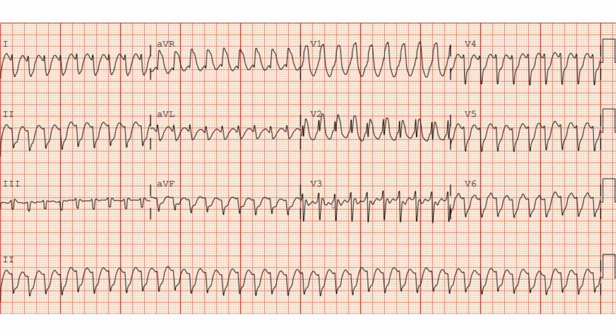Remember, all of these QRSs vertically are the same, so this QRS is the same as this QRS. So you pick a time where you know the QRS starts and ends. I mean, we can clearly see it starts here and ends there. When we follow this down, we can see, boom, that's the beginning of the QRS, and we follow this down, that's the end of the QRS. So this whole thing right here is the QRS, and it's definitely wide.